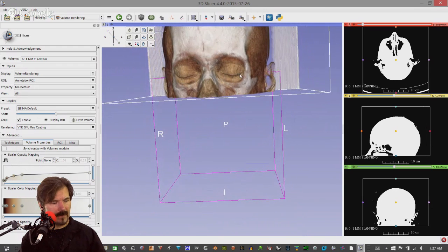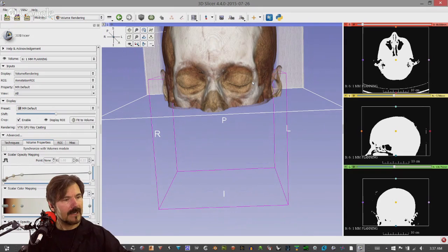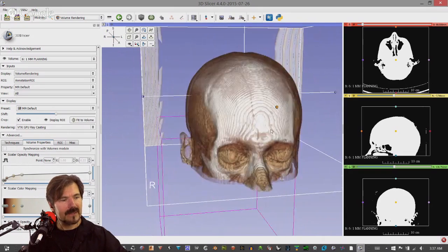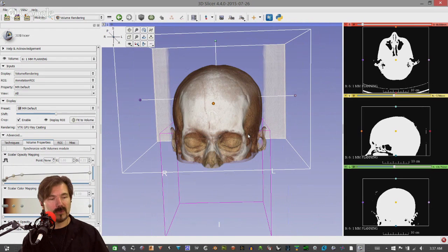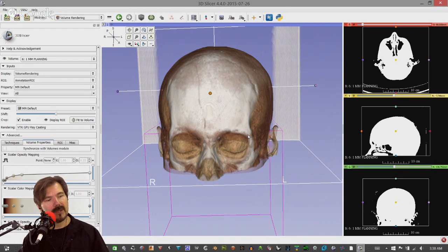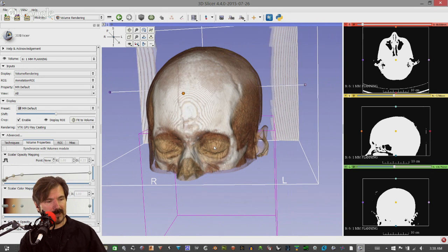That looks nice. Isn't it? I mean, it's very realistic. And one of the things that I identified before, it's almost photorealistic. So you can get high quality anatomical images that you can use for reference in discussions, meetings, and so forth very quickly using this application.